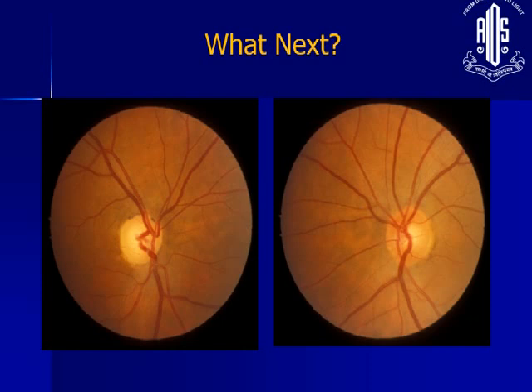If so, which one? Since this is a class on pale or swollen disc, I can tell you that none of the discs are swollen. So what do you think? Dr. Sood says that he's not very happy with the right optic nerve. And it does appear that the right optic nerve is a little paler than the left nerve.